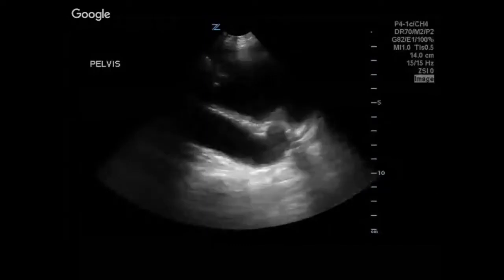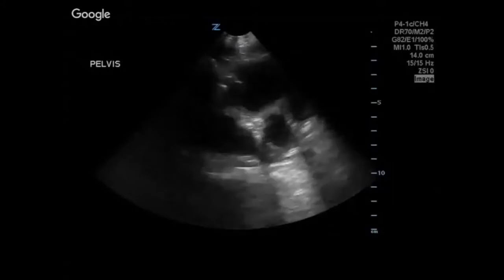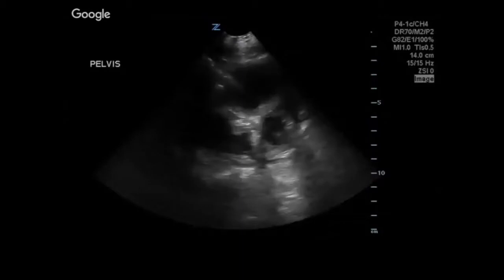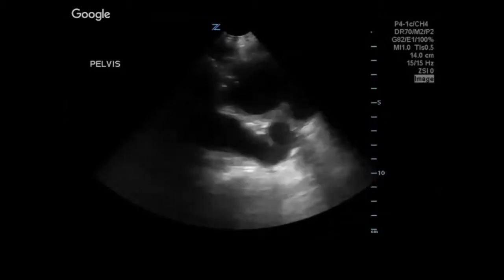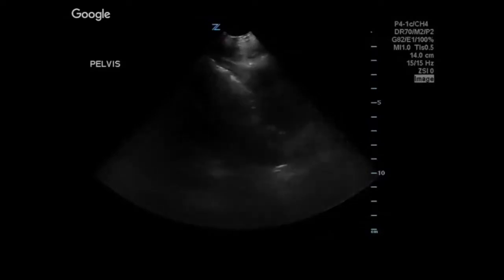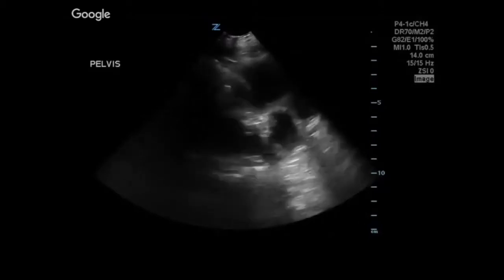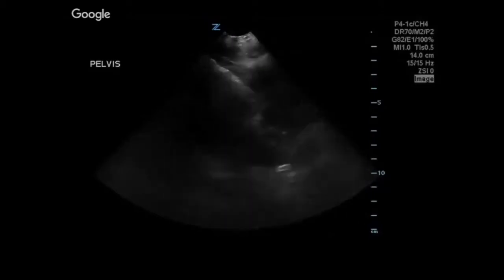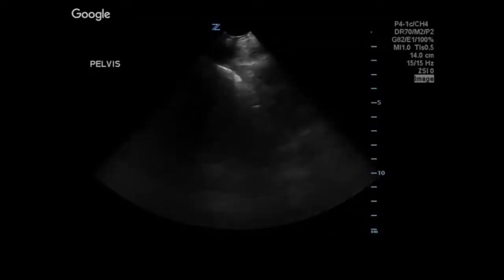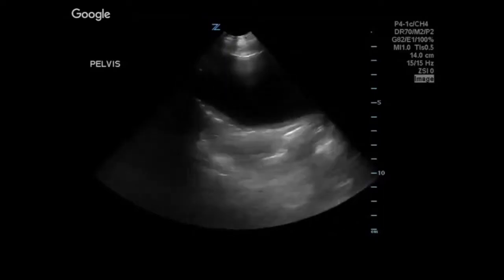And here, what is that? You're in the pelvis. You have the bladder. And what is that huge tubular structure underneath the bladder? It's a boy. Just to make it simpler. Maybe it's a girl, but it's a prostate. No, it's a mega ureter that bulges into the bladder. It's a hydroureter. Really? Yeah, it's huge, right? I've never seen them. Yeah, it's a ureter that bulges into the bladder.